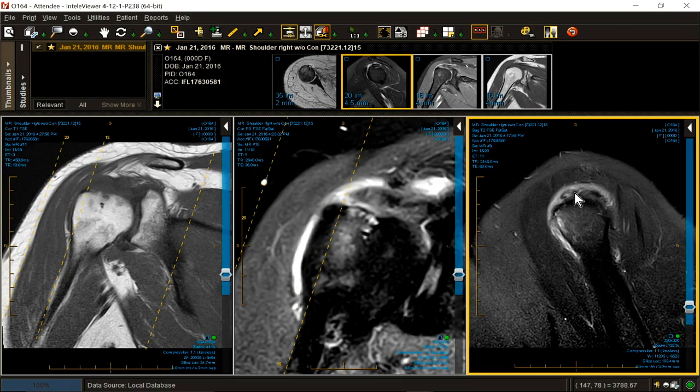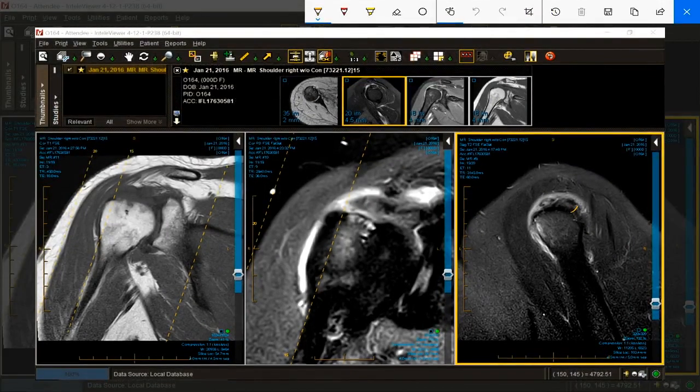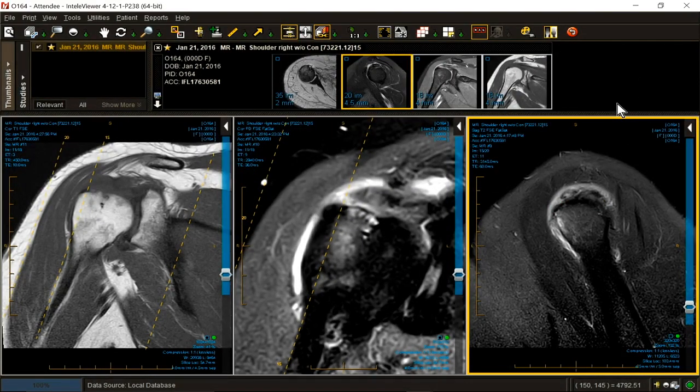That cap of dark signal looks a little bit like Bart Simpson with Bart Simpson's hair. There's the hair. Maybe Bart Simpson's hair is a little roughed up over here. And then there's no hair right here. Where is Bart Simpson's hair? Over there. It's a hole. It's missing. What's in there? Inflammatory tissue.